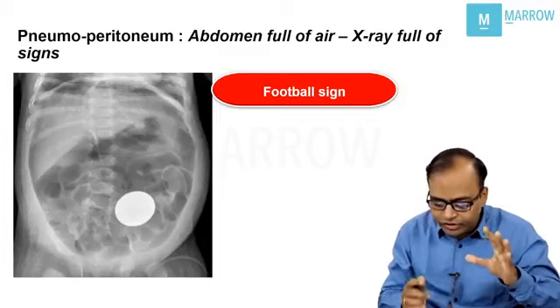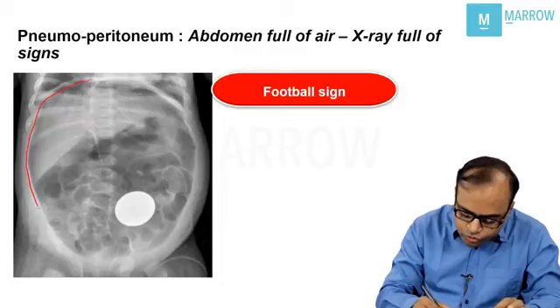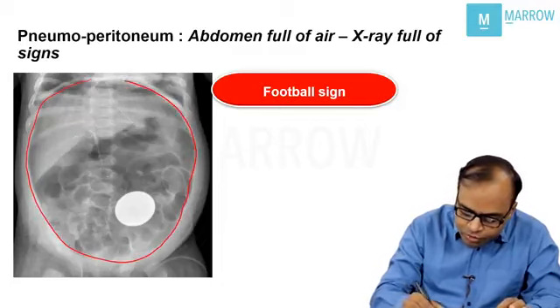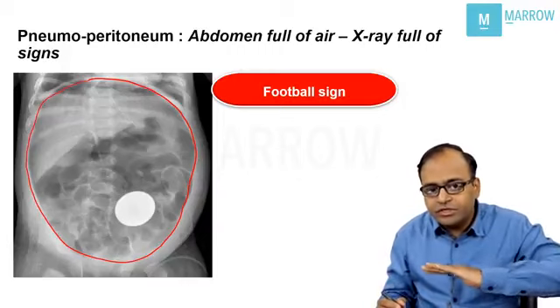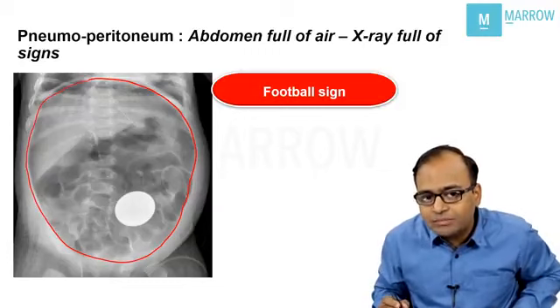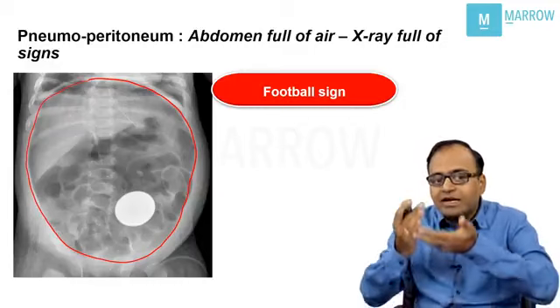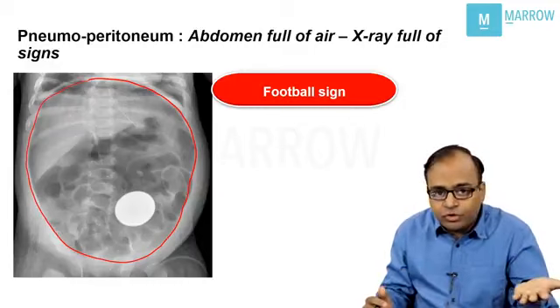Now watch very carefully here. In the abdomen, can you see a round lucency like this? More or less over the central abdomen. Can you see this round black appearance or lucent appearance? Now what happens is when the patient is supine, remember that air in the body always has a property. It always tries to ascend up to the most non-dependent part. So what happens in the supine position, where will all the air go?